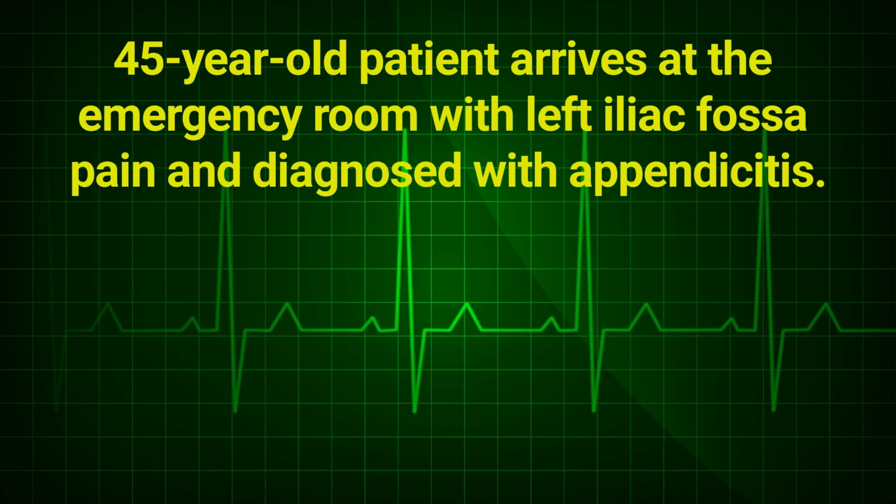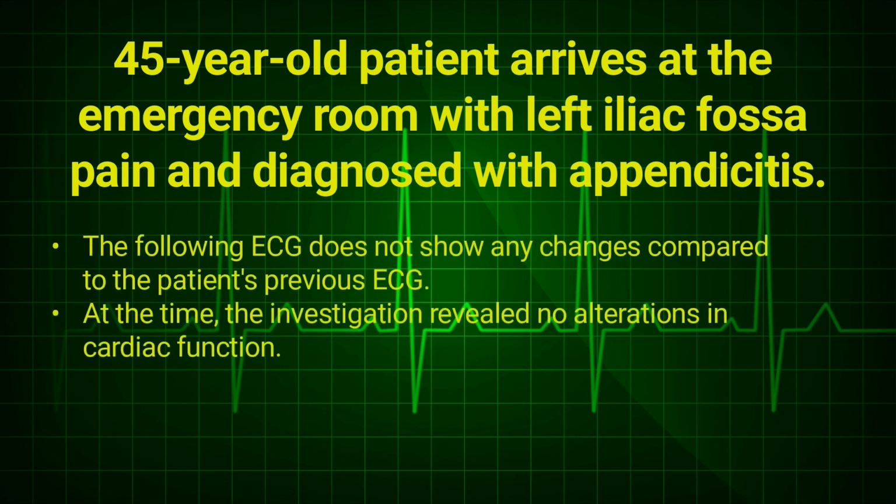It's worth noting that this patient had a previous electrocardiogram from a few years ago, which was identical to the one we will show next, meaning there were no changes in the ECG during that period. The patient's electrocardiogram did not reveal any functional or structural heart disease.